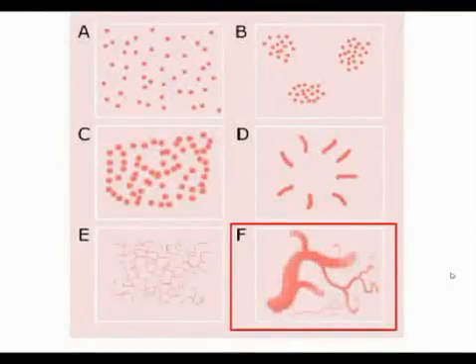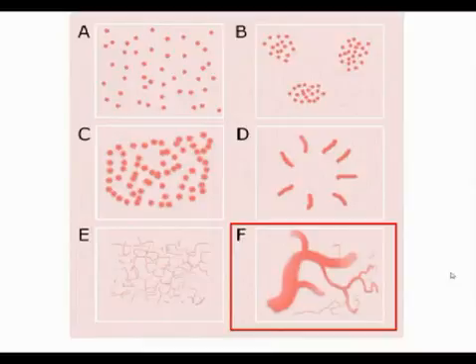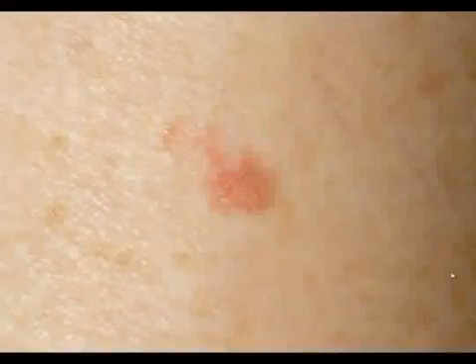This arrangement is very common. It occurs with serpentine vessels, and we call it branched arrangement, which means that from a thick serpentine vessel there are many thinner serpentine vessels branching off. This is an example. Clinically, dermoscopically, you can see linear serpentine vessels in a branched arrangement. So branched serpentine vessels. In the metaphoric language, they're called arborizing or tree-like vessels.